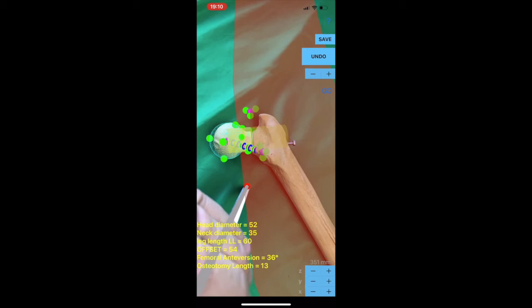By default, the osteotomy length distance begins with 0 starting from trochanter minor, T point. Bone saw cut navigation. Once the position of the coronal plane of femoral neck resection is defined and a red hazy transparent osteotomy plane is depicted, coronal, passing through the femoral neck constantly in augmented reality.